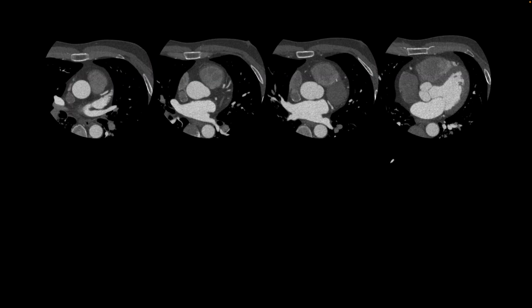Here is our first patient, and they presented with chest pain and a coronary CT angiography was performed. And here we are looking at images from that study where we want to focus on the LAD. Coronary arteries are epicardial in location and they're surrounded by epicardial fat, what we see here. And sometimes we see what we call myocardial bridging, where especially the LAD dips down into the myocardium right here, more distal to this level. And then more distally, it further appears back into the epicardium.